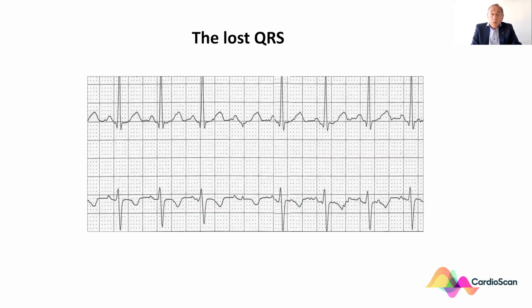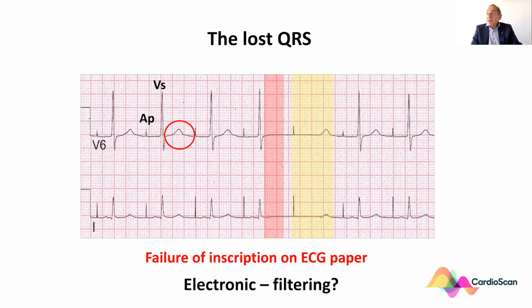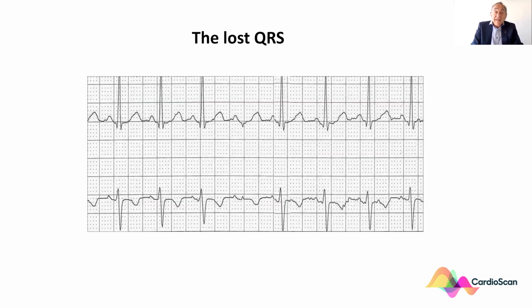Here is another one, and you can see that again, it looks as if there is a high threshold exit block. Oops, I have to start that again. I'll just go, okay.